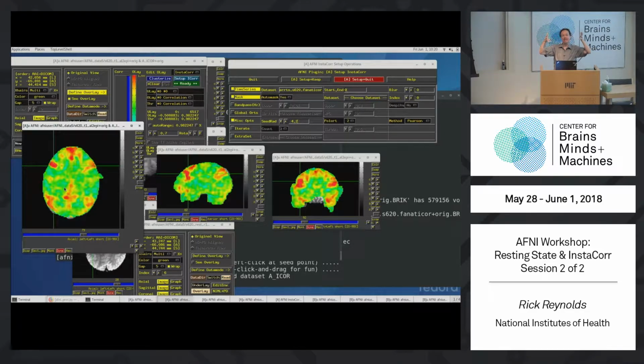That gives you a t-stat across space for every one of your 50 subjects, if your computer has enough RAM to handle this. And it doesn't take that much. It's not so incredible. I could do a lot of subjects on my laptop. And then after it does the t-test, it converts that t-stat to a normalized z-score as well. And that's what it projects in the image.